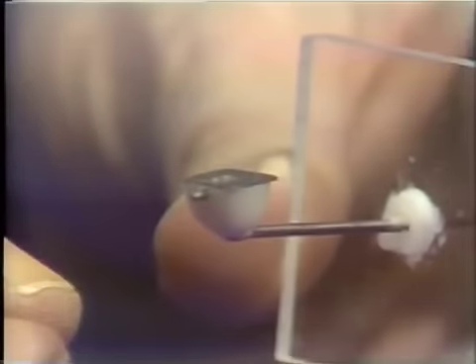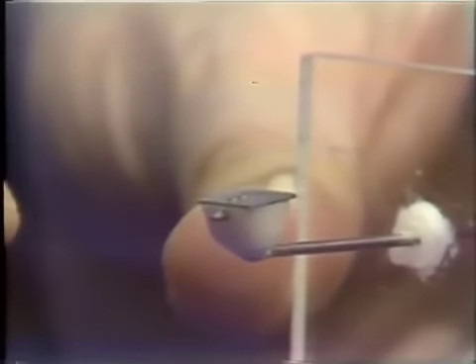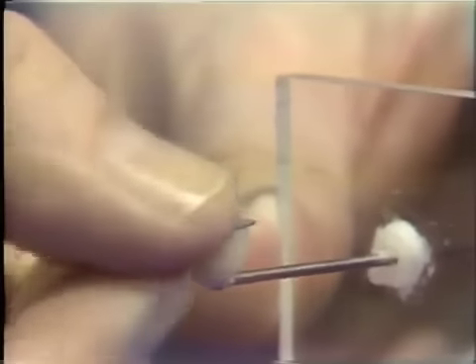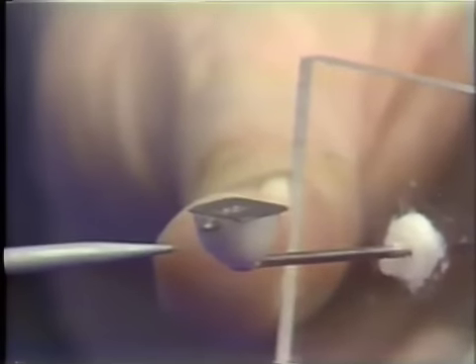There is a modification of this type of Pontic which was at one time used quite extensively, and you may come across clinical cases in which it is in use. It's not used too much at the present time. It's the Steele's porcelain sanitary Pontic, and here is a typical Pontic of this type. It has a precious metal table which slides on and off the top of the Pontic here. The lower part of the Pontic is intended to be shaped and to go against the mucosal surface.